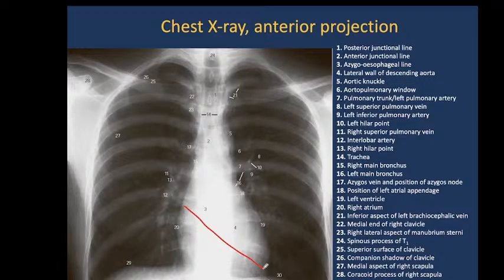try to see position by the special vector between the basic part of the heart and the apex of the heart, and they evaluate the angle which we can construct between the horizontal line and the heart vector.